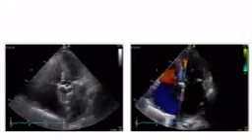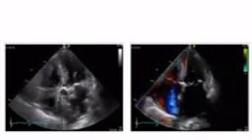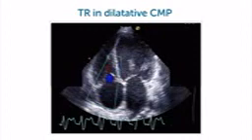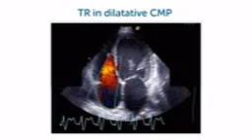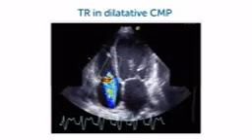And here we also have a left heart problem, a patient with aortic stenosis, probably with diastolic dysfunction, also pulmonary hypertension, and then eventually also tricuspid regurgitation, which I think you will agree is maybe moderate. And finally, very frequently we will see it in patients who have left ventricular dysfunction. This is a patient with dilated cardiomyopathy, poor left ventricular function, and a dilated left atrium. Again, the patient probably has pulmonary hypertension, and as a consequence, he develops tricuspid regurgitation.